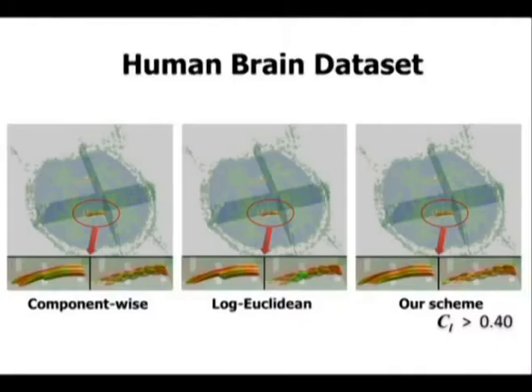In order to demonstrate the effectiveness of our approach, we try to downsample the human data and then apply the proposed interpolation scheme to extract the underlying continuous behaviors of 3D diffusion tensor fields. Apart from the local region around degenerate points, our approach can track the fibers better than conventional interpolation schemes. This is such a result, where we track fibers in the tensor fields without degenerate points.